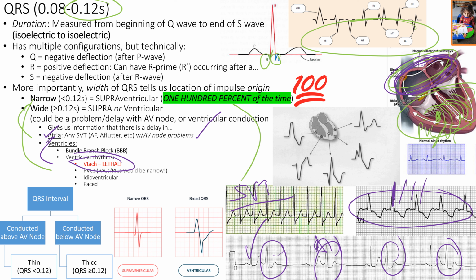So yeah, that's the idea behind these rhythms and the intervals. The importance of the intervals is recognizing it, interpreting the information, analyzing the information that's in front of you, and then what do I do about it? What are the possible causes? What are the possible complications? What are my nursing interventions I do for it, right?